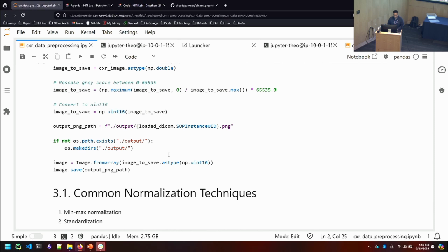Back to the hyperlink where we can copy all of this stuff for the terminal code.